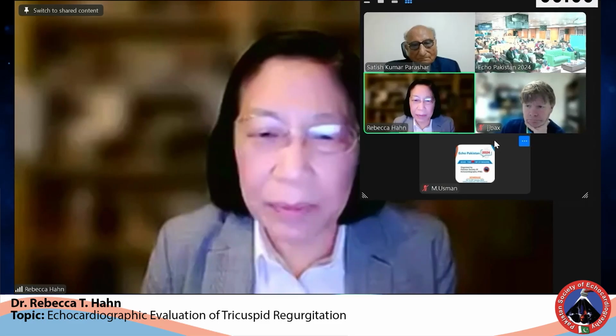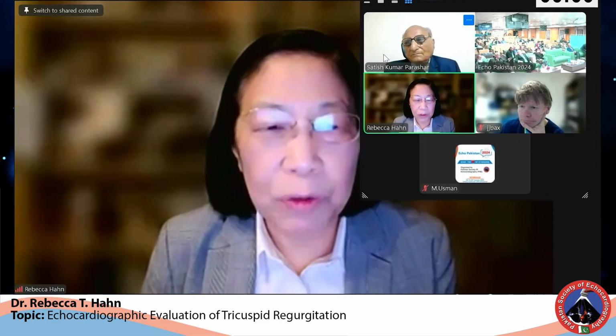I'm going to speak about the echocardiographic evaluation of tricuspid regurgitation. These are my disclosures. The echocardiographic tasks for evaluating TR include quantifying the severity, defining the etiology, determining right heart pathophysiology, and then determining the anatomic eligibility for device therapy. And we'll try to cover those in the next few minutes.